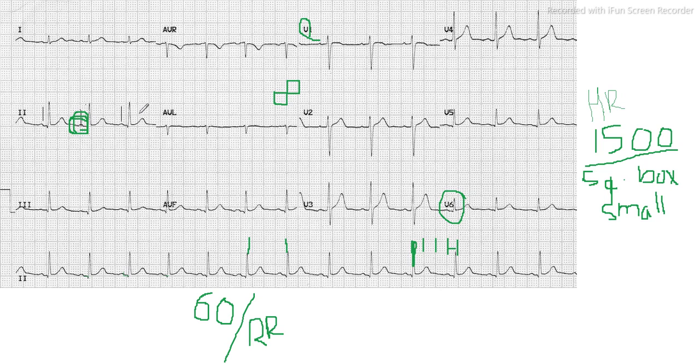And again, to find left atrial enlargement you can see lead 2, where it is normal morphology, whereas in lead V1 you have a biphasic P wave. So this is also normal, so there is no atrial enlargement.